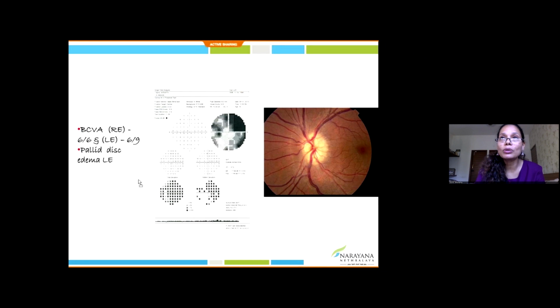And remember, whatever we do, it has to be correlated ophthalmologically with all your retina, optic nerve, and other findings, and neurologically with your MRI scan. But just for your understanding, I wanted to show you, if you keep both the field tests together, you'll notice that because it's involving one eye, we are looking at anterior to the chiasma.